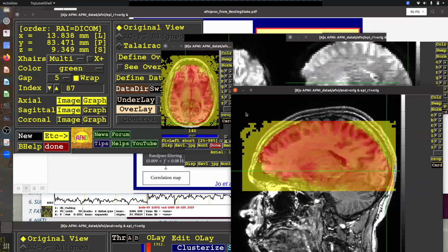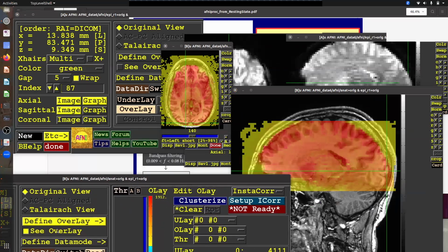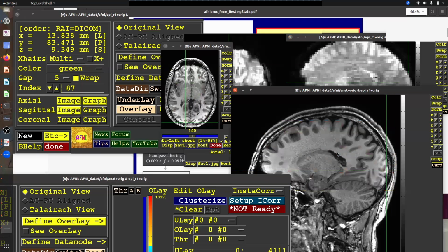Because we want to leverage the different benefits or the different main features of each kind of data set. This data set doesn't have good spatial features. So if we want to warp this brain to a standard template, it's fairly ugly and not very detailed. This data set, on the other hand, has nice details. So this is one we can align with a standard template brain well. If we can align this one to this one, and then this one to a template, we can chain together those transformations, and our fMRI data ends up in final space.